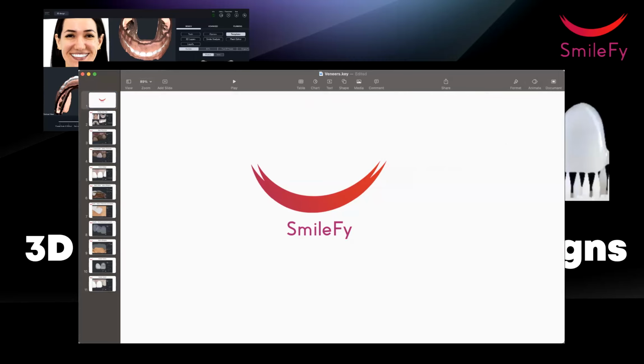So, as mentioned, our newest release with SmileFy includes a lot of new and very unique features. And I'm happy to show you how everything works, how we change the workflows, how we created something that is more complete compared to everyone else who creates veneers. And for us, it's very important to have a workflow which is very clean and very fast. So first, I'm going to show you what we're going to do step by step so that you understand the principle of the workflow, and then we will go over to the app and show you everything in the software.